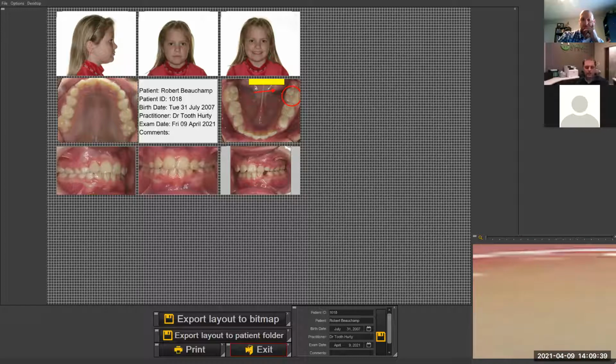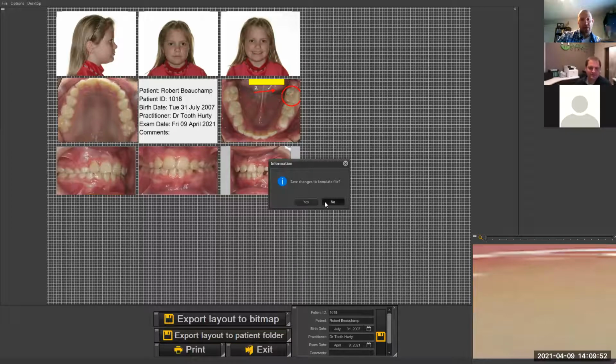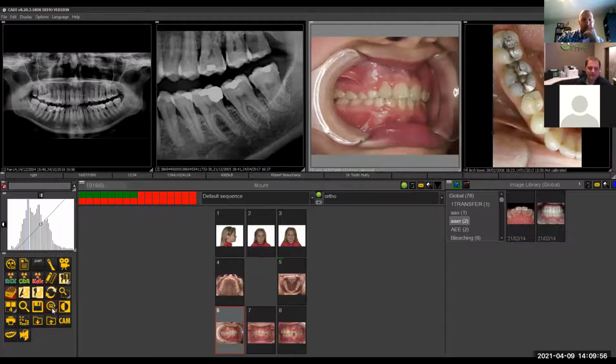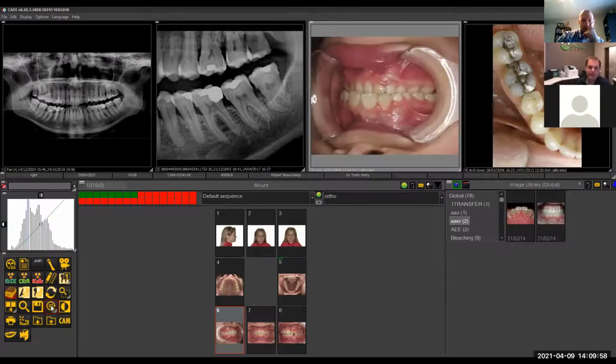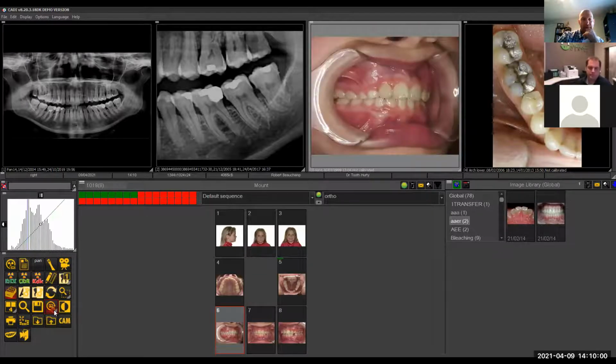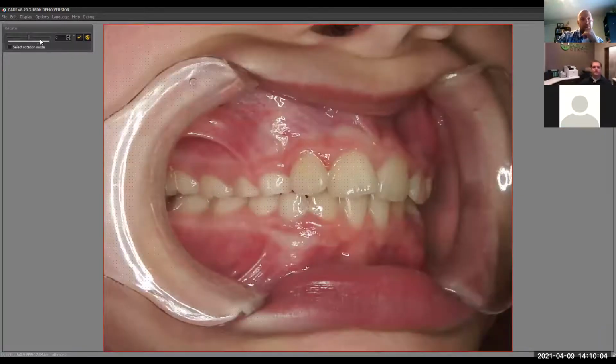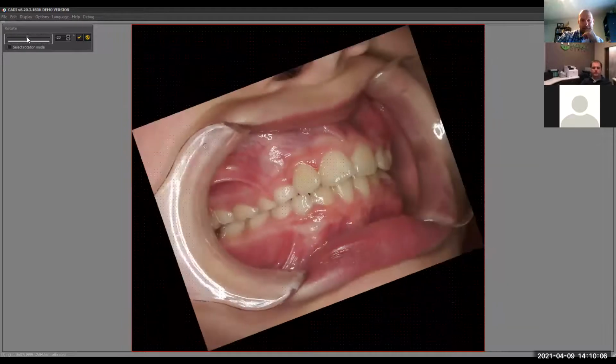Sometimes you get that one assistant that never gets the horizon exactly level. Like, it's just askew slightly. Well, there is a way, actually, I'll show you that. So no, I won't save changes, but if you did get an image like that, you double click, there is this rotation, which we have 90-degree, but the second button is freehand rotate. Oh, perfect. So this is where now you can kind of just do this type of thing.